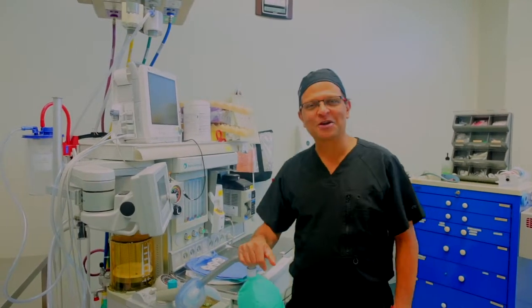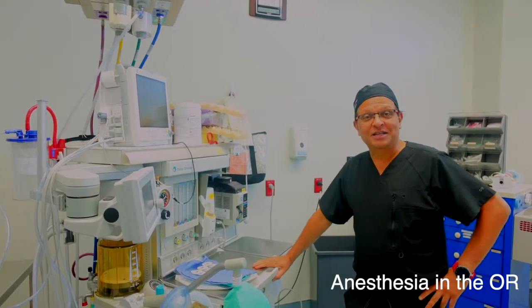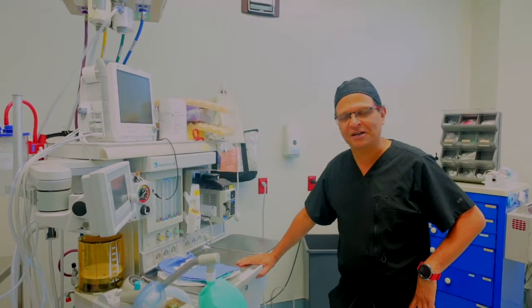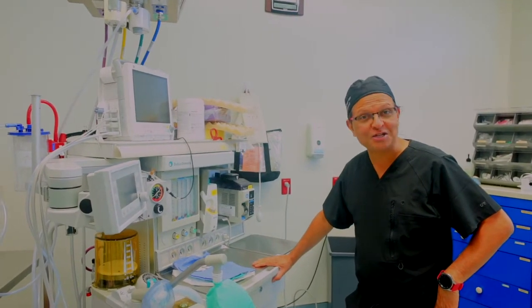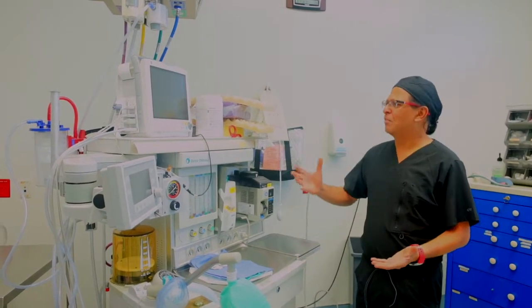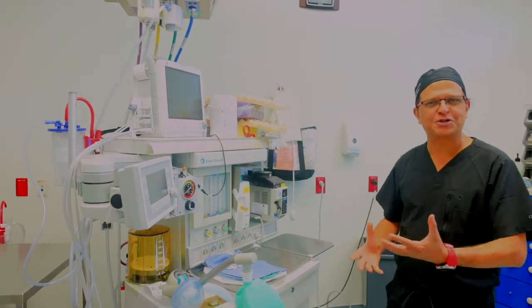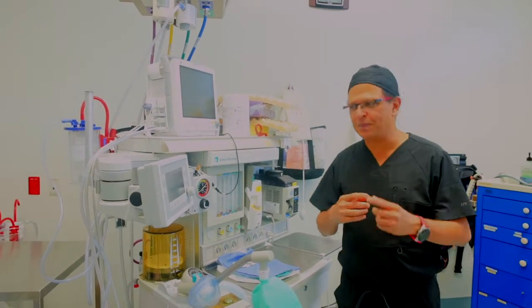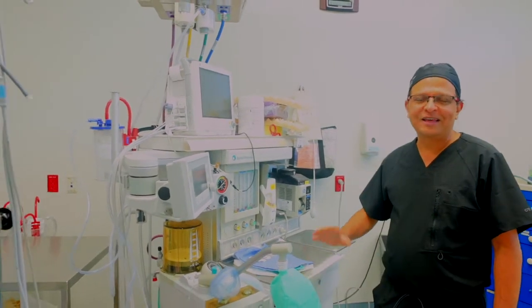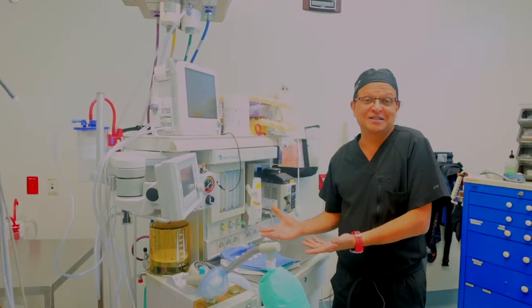I wanted to show you what anesthesia means and what the anesthesia machine looks like so that you have a basic idea, because most of the patients, when they walk in, get overwhelmed with multiple monitors going off, with the beeping noise, with the blood pressure, with the EKG pads and the pulse oximeter and what have you. So I just wanted to ease that tension by introducing what the anesthesia machine does.